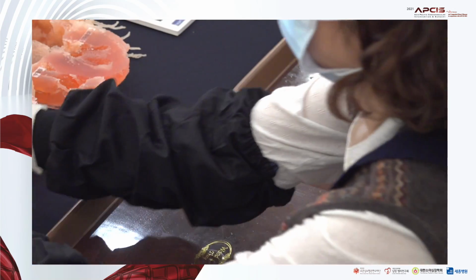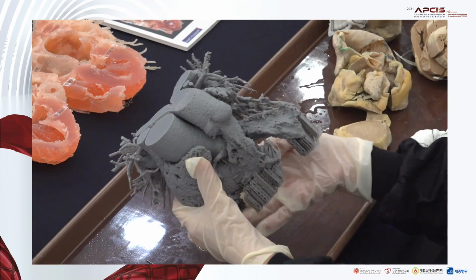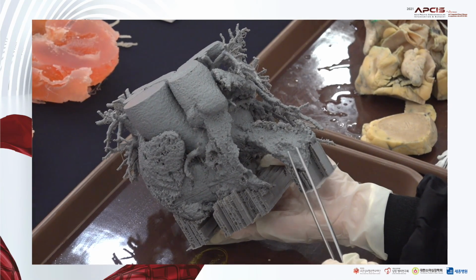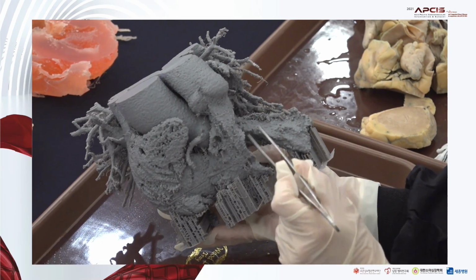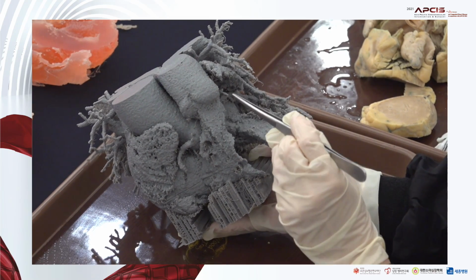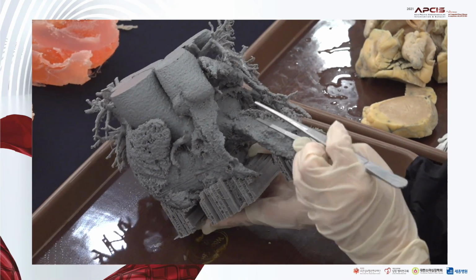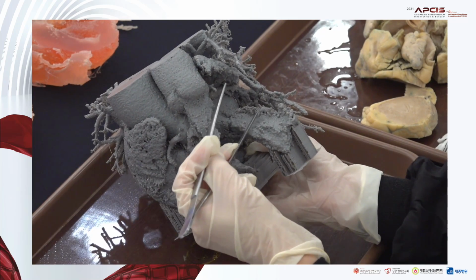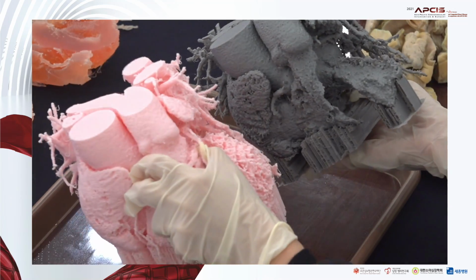But when you look at systolic phase heart, this is the three-dimensional heart of the systolic phase. So here, luminal side is much smaller. And here, this is the left anterior descending coronary. So that means the left ventricular wall thickness is like this. Maybe it's better to compare side by side.